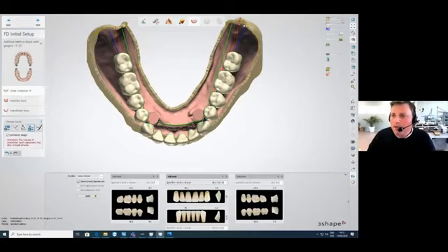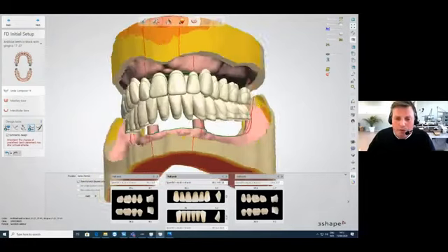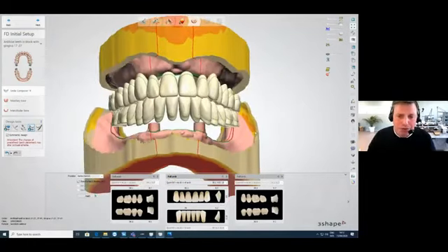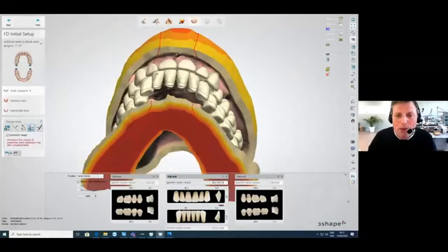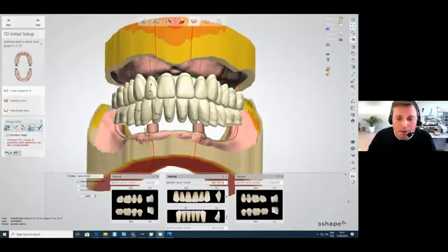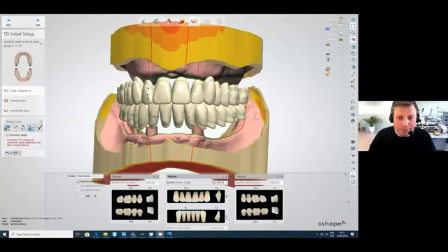So here you will see, with some simple movements, you can easily make a second or third class bite. All the things are in the free morphing tools. So just place your complete block of your upper or lower teeth on the perfect spot, and then make them bigger or smaller to close the diastemas or the area you have to cover.